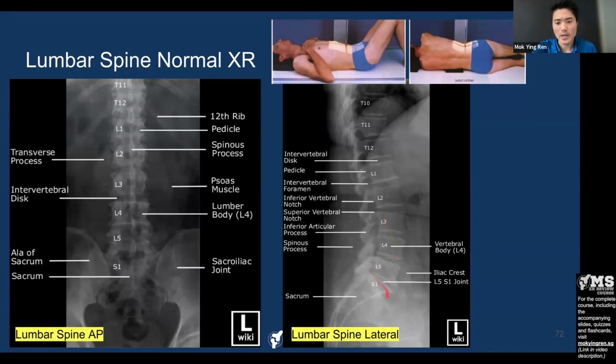Spondylosis, okay? Now, I just want to make a note here on counting the levels, all right? Because every time we count from S1 from the bottom, you may get it right, okay? But sometimes there is what we call a sacralized L5. It means the L5 is now fused to the sacrum. And you can wrongly count that as an S1 and then proceed upwards in an erroneous fashion.